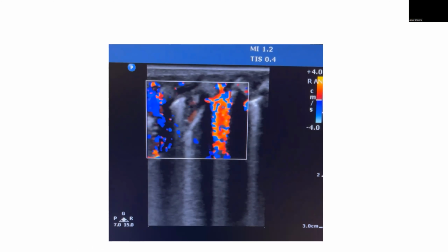Okay, perfect. Once you're using that, see whether you can see focal areas of blood vessels. On Sunday, when I show you images of lung recruitment, we'll show you a lot of areas of small focal consolidations, because one of the questions we ask ourselves for this kind of baby is whether that area of lung will be recruitable or not. On CPAP, you might be able to put the PEEP up to recruit.